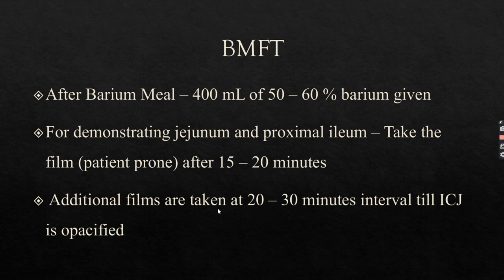The vertebral column, the stomach part, the small bowel, the arrow showing the small bowel, there's a pelvic girdle. Although the picture is not very clear, this is how a barium meal follow through looks. Then BMFT, what are the things we are supposed to do in BMFT?